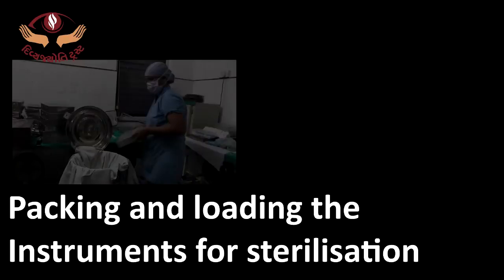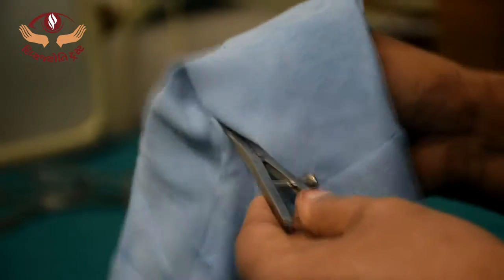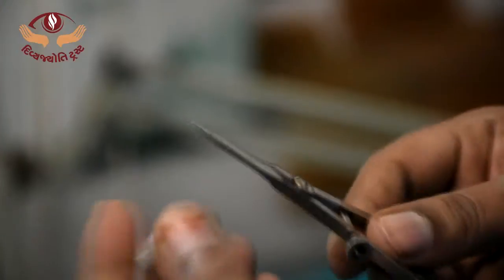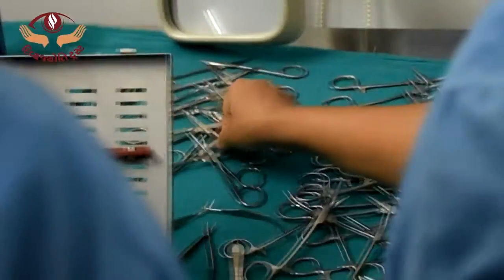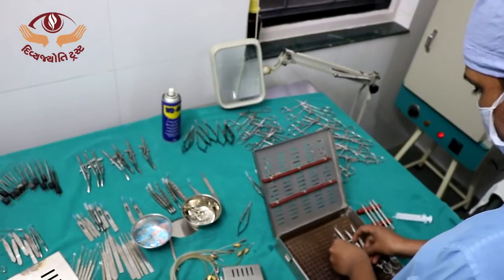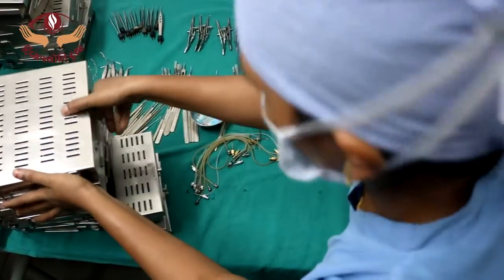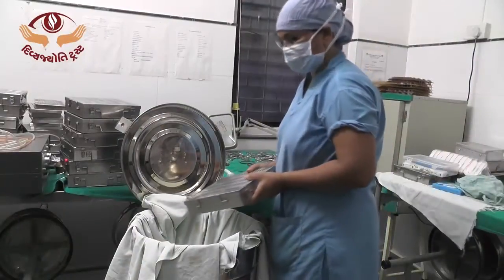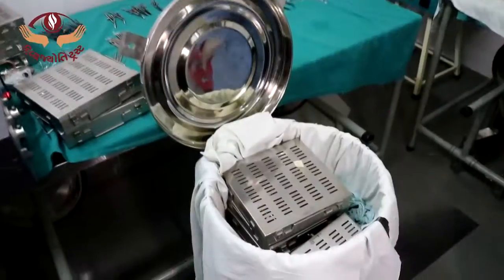Packaging and loading the instruments for sterilization. The instruments are then dried with a clean towel, tipped with a plastic sleeve, and segregated into separate sets. They are then packed in individual perforated stainless steel trays, which are placed in the bins with indicator. 3 indicator tapes should be placed inside, 1 at the bottom, 1 in the middle, and 1 on the top of the bin, and 1 on the external surface of the bin.